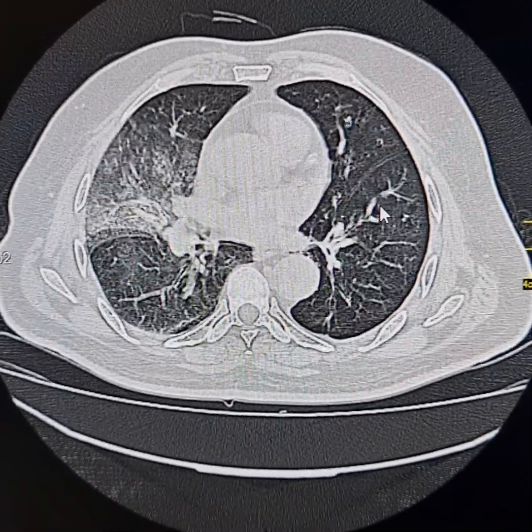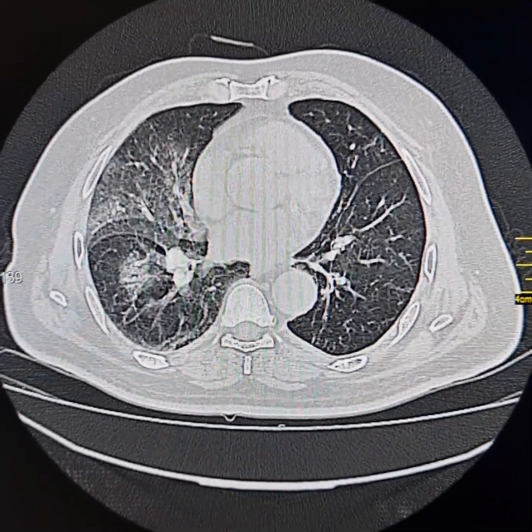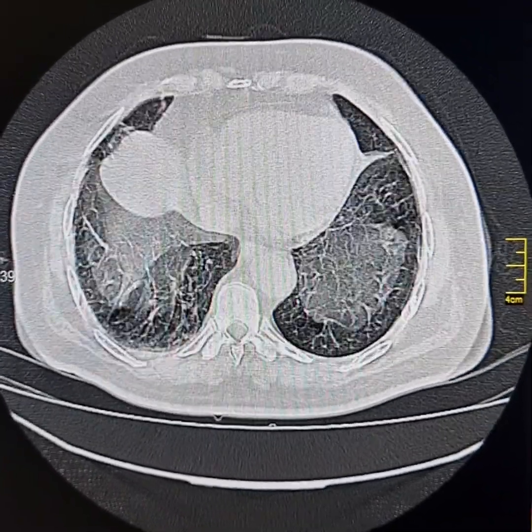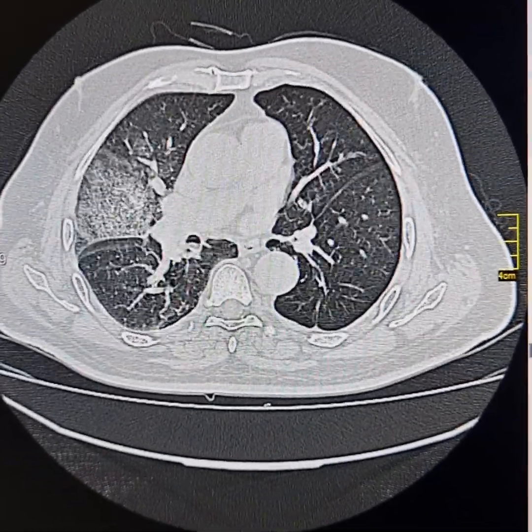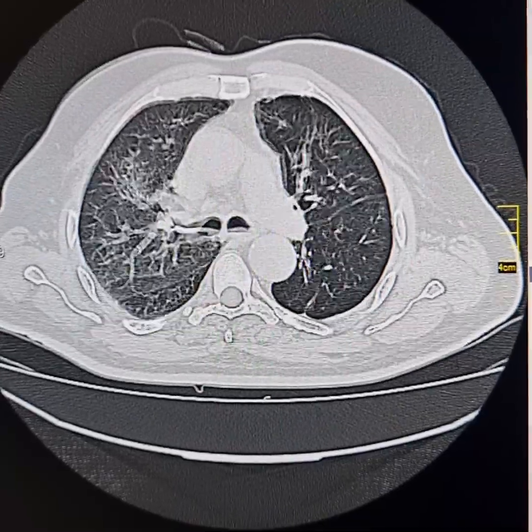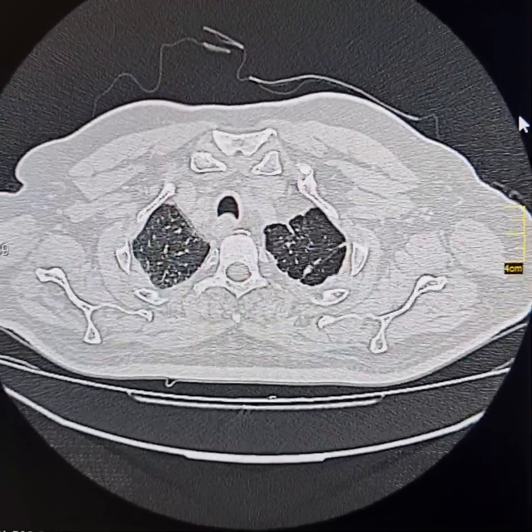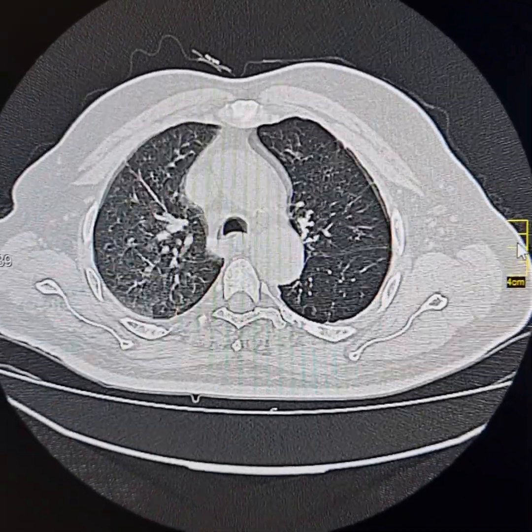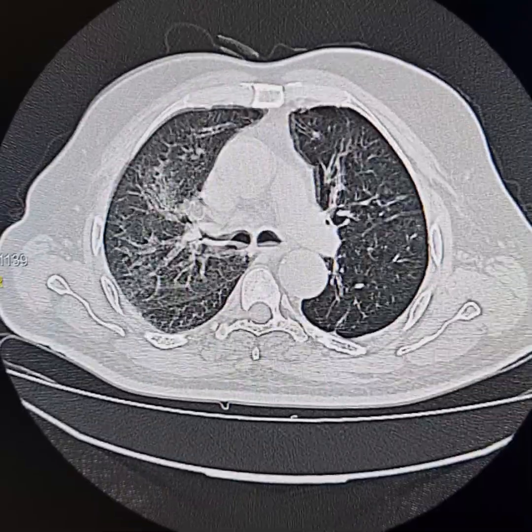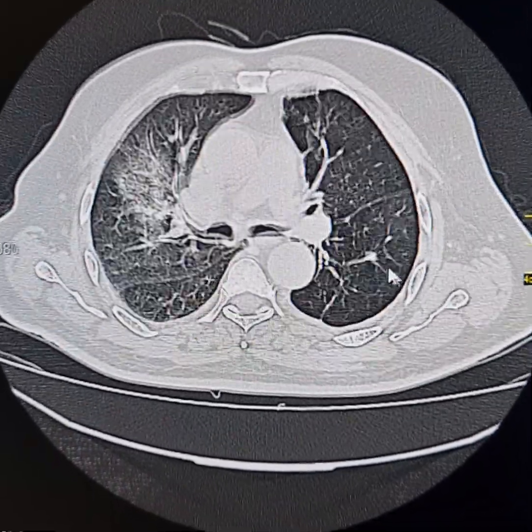First, I will brief you about the left lung. Please observe that the left hemithorax is almost of the same size. There is no significant mediastinal shift. However, it is very hyperlucent as compared to the right one, and old tuberculous lesions are present in the apico-posterior segment of the left upper lobe and apical segment of the left lower lobe.